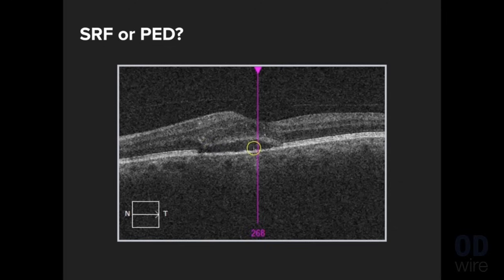Yes, you've got subretinal fluid, a hyporeflective space between the RPE and the ellipsoid zone. That space is subretinal fluid. So this is a patient with SRF, subretinal fluid. We use the abbreviations because it makes charting much easier. The jargon is quite useful in discussions as well. SRF.